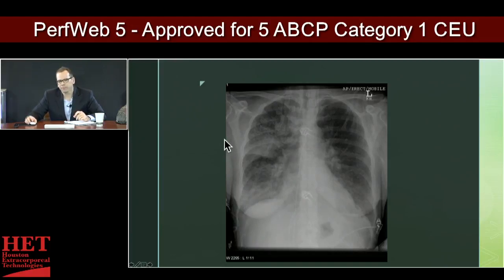What are these two kind of bright structures? Let me just point for a minute. You see that one. EKG pad. You think that? Yeah. So those are the clips that attach the EKG leads to the patient.